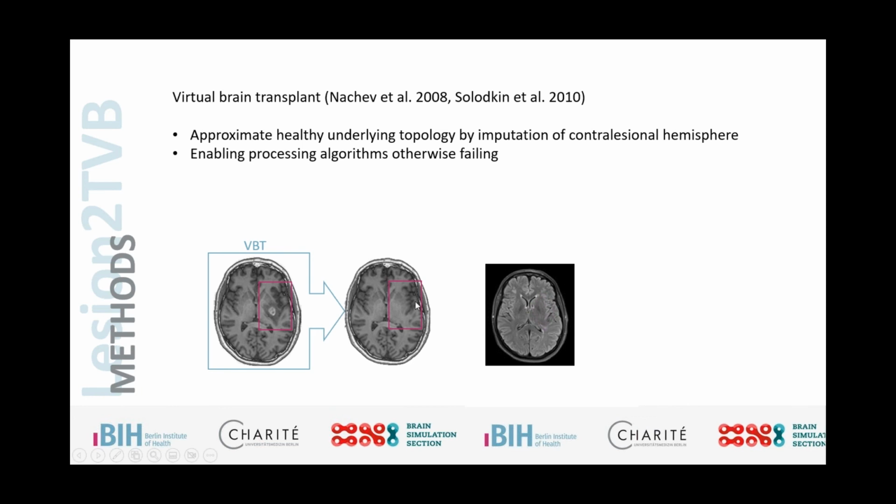Now we can actually perform surface registration because we see clearly here the cortical folding again, as opposed to here where we did not see it because we couldn't differentiate between actual lesion signal and cortical ribbon simply because of the similarity of the intensity values. If we remember, we now have this flat, almost normal distribution of intensity values as opposed to the bias towards the lighter signal in the healthy tissue.